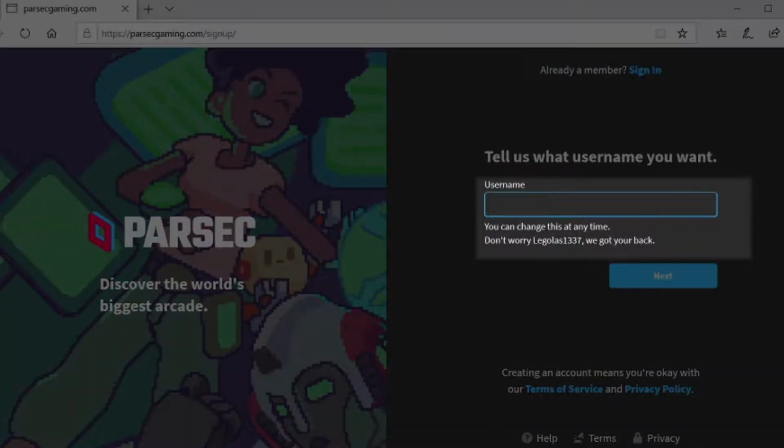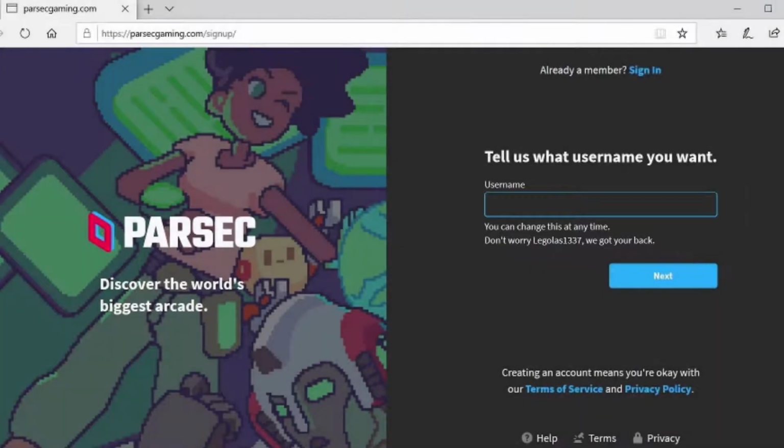This is what your clients will see when they open up Parsec, or for a home user will be the name your supervising clinician uses to identify you. If you're a clinician, you can enter your name or practice name here. For home users, I would recommend talking with your supervising clinician to find out if there's a format they'd like your username to be in.